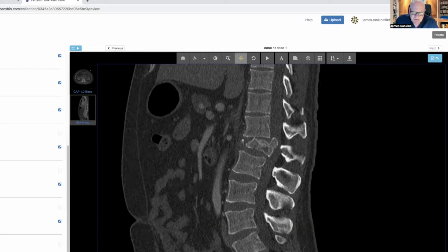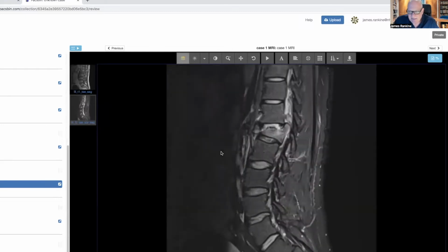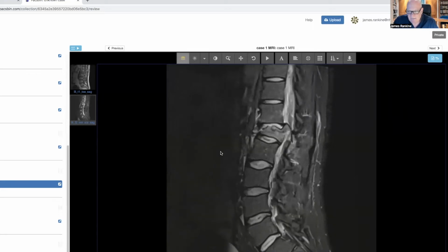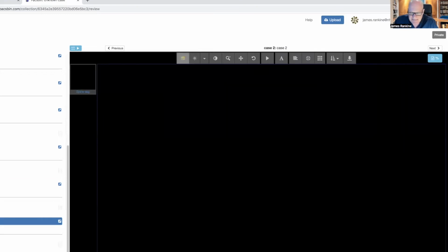case number 2. Just to say, on this sort of burst fracture, if we do an MR, and in fact, here is the MR of that case, we're not actually doing the MR to look at ligamentous structures because we know that the ligamentous structures are intact. What we're doing the MR for is to see what effect the burst has had on the neural structures, and in this case, the conus. The spinal cord and the conus, of course, are very easily injured on a burst fracture, whereas the cauda equina is much more forgiving. So we'll move on to the second case.